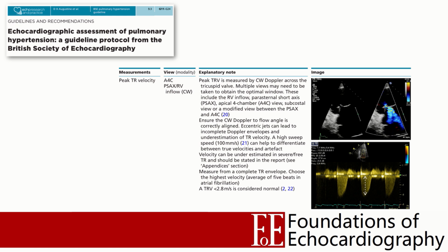Firstly, we need to start with a value for right atrial pressure. In critical care, it's common to site central venous catheters in the internal jugular or subclavian veins, and for the tip to sit at the entrance of the right atrium. If we transduce this catheter and obtain a reliable waveform, we might choose to substitute this measurement for the RAP.